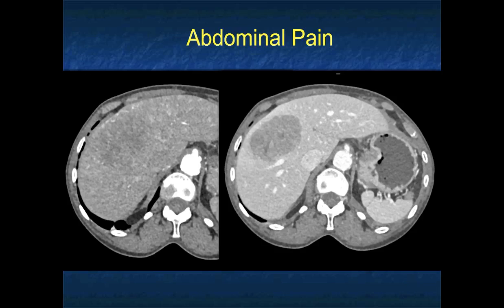This patient has abdominal pain. Interestingly, you see the mass much better on the venous than arterial phase imaging. You can go through a differential diagnosis. The liver is not cirrhotic. Could be a cholangio. The lesion is not very vascular. Could be metastasis. I'm really thinking about malignancy. I'm not thinking about FNH or hepatic adenoma or hemangioma.